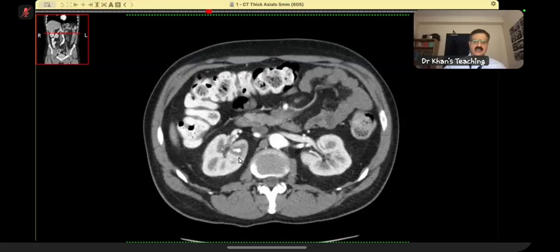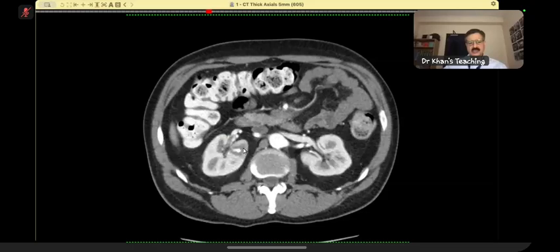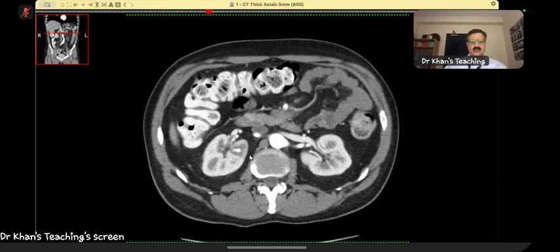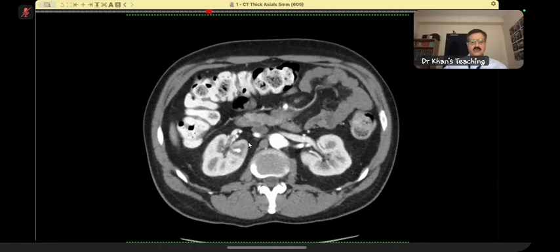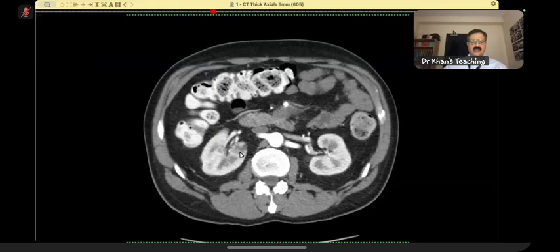Then there is an aneurysm. At this point, there should not be any blood vessel inside. Now, if you see carefully, look at this cortex versus this cortex, and this cortex is enhancing less. So you have to point that out, that this is an acute infarction developing, and maybe there is already a bit of a defect there, so it must be acute over chronic type of infarction there.